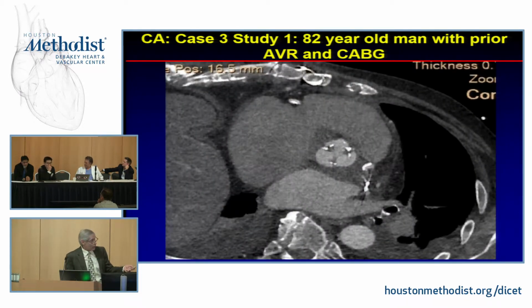Okay, so there's a bioprosthetic valve. Look around the valve. This was a patient who came in with fever with a bioprosthetic valve.